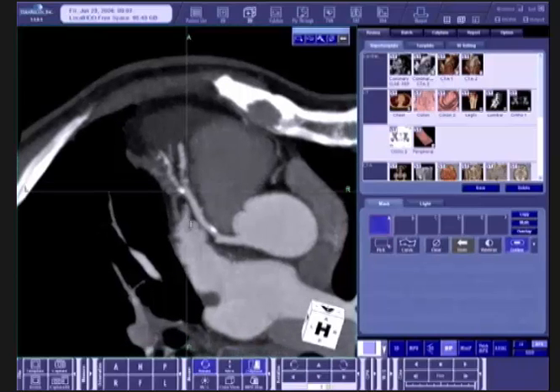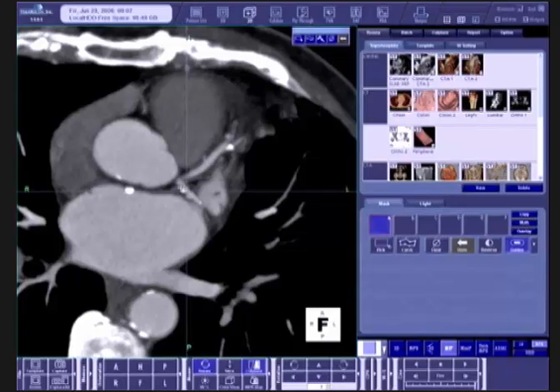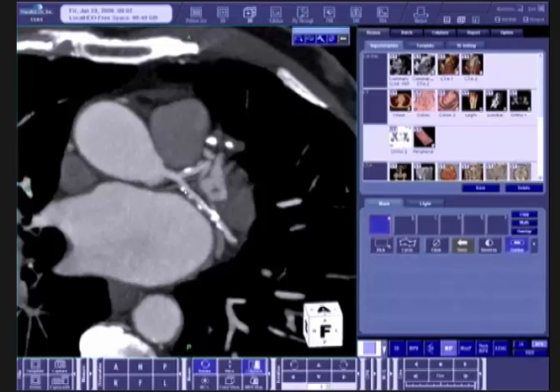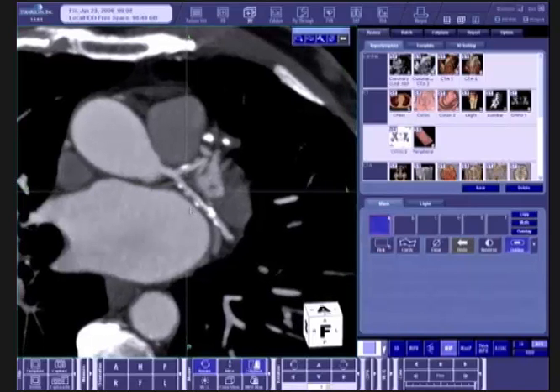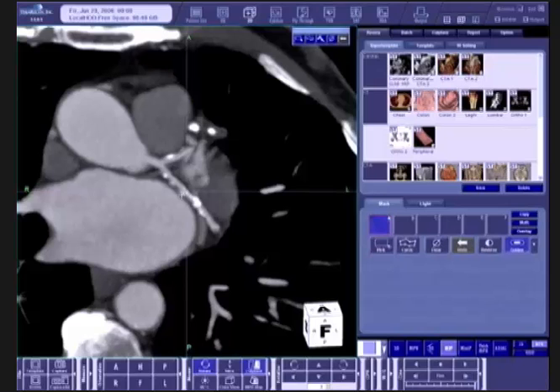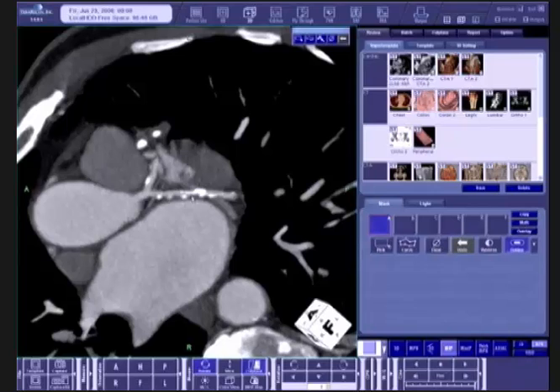We can also look at another portion of the same heart by looking at the circumflex artery. In this particular example, you can see a combination of hard followed by soft plaque and a linear area of calcification. Let's look at this first area approximately here. I will make this somewhat horizontal, and I wish to again rotate about this axis to look at that particular region.